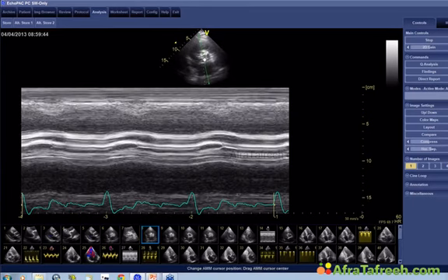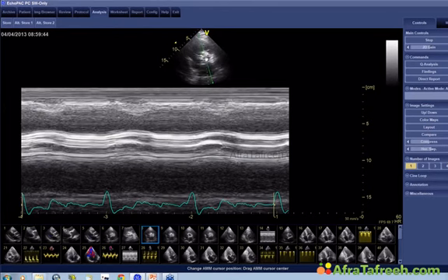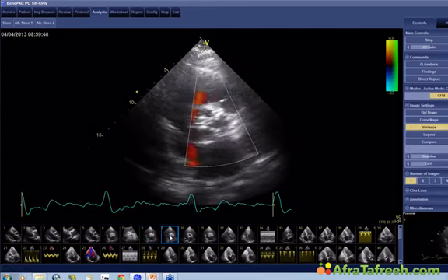So this is the limitation of M mode, and this is also the reason why I don't think M mode alone is very good in quantifying the degree of stenosis. That's what we did previously, before we had 2D imaging. But nowadays, it's just a little helpful thing that you can use aside from the 2D image. But it does work sometimes.